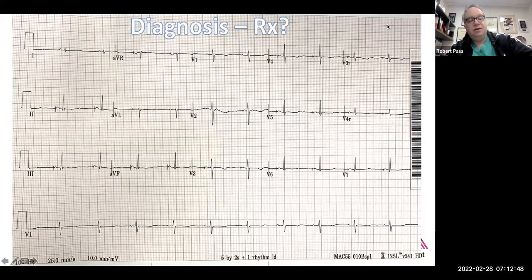That's exactly right. A lot of times patients with long QT, in order to get a good amount of beta blockade, become so bradycardic that they might benefit from atrial pacing. And that's the case in this patient. This patient is essentially atrially paced all the time. I think it's programmed AAIR with a lower rate of 50. And this patient presented with torsade actually initially. And it's an interesting case.